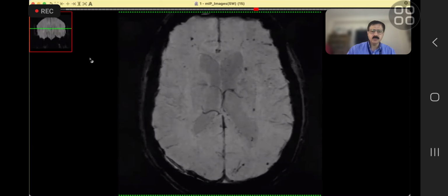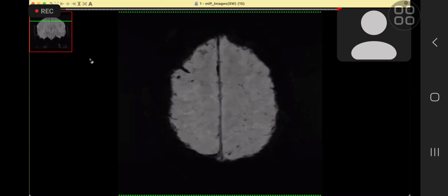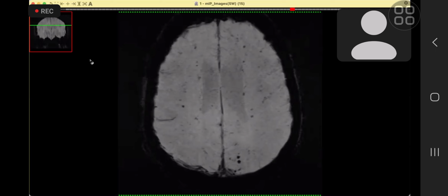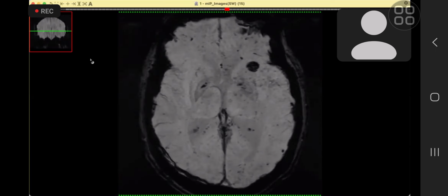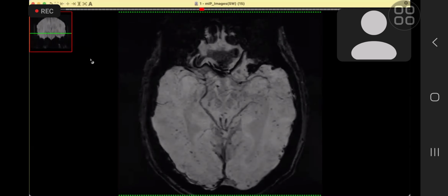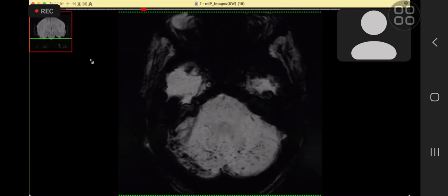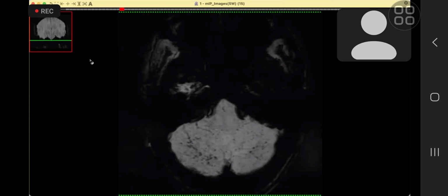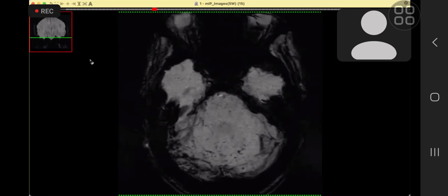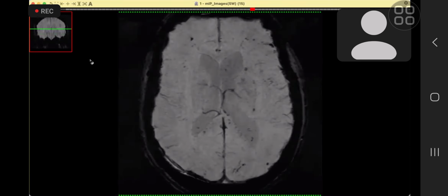Many of those high intensity foci on the FLAIR sequences show signal void on GRE sequences. I am suspecting micropunctate hemorrhagic foci, which would further warrant diffuse axonal injury in this patient, but the splenium was normal. These scattered foci were also identified in the cerebellar region as well.